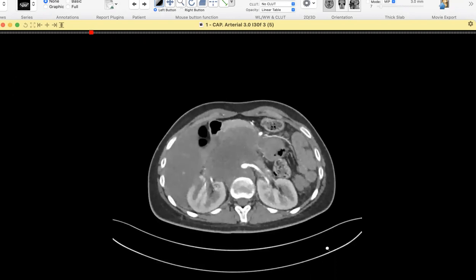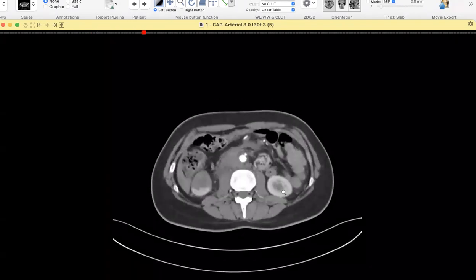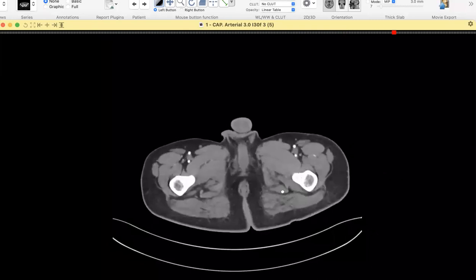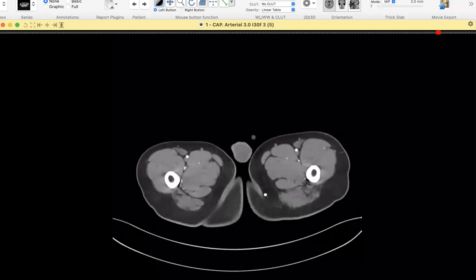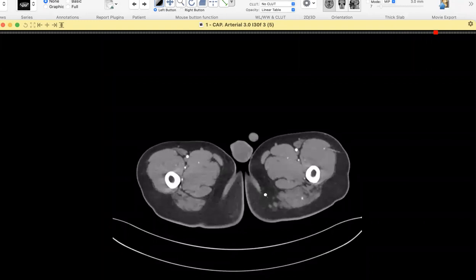So lymphadenopathy can be due to lymphoma, can be infectious due to TB, can be metastatic, and in a male patient, most commonly metastatic, we'll think of testicular tumors. This is a young patient, and I guess you were in a rush, so you just ignored the description of the testis. There's only one testis here. So okay, this was an operated malignant germ cell tumor of the testis, and he had this recurrent metastasis.